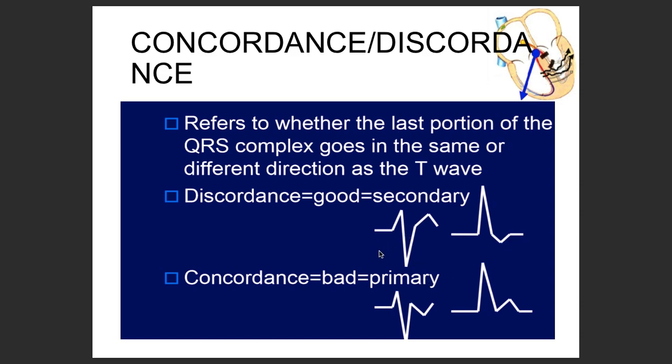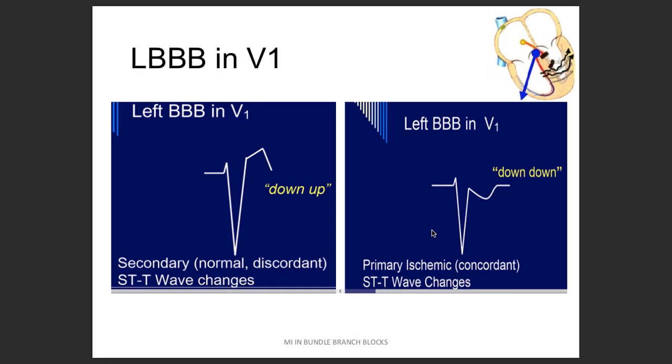And there are some examples. So for example, like this one. The majority is a negative deflection, but this is positive, right? So this will be an example of discordance. It is a simple thing. Everything is positive, concordance. Everything is negative, concordance. But if something is positive and something is negative, on the opposite side, that is discordance. The word itself explains it.